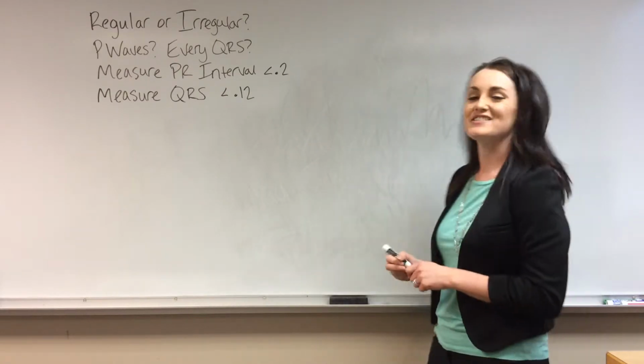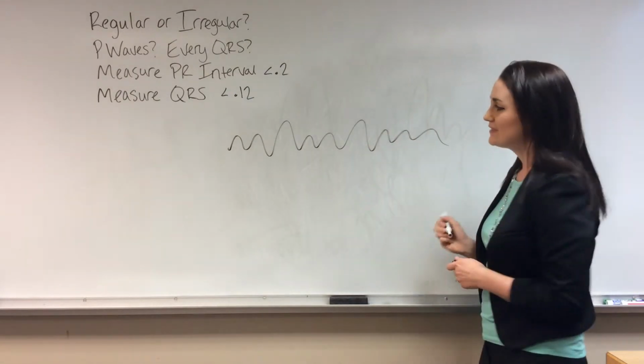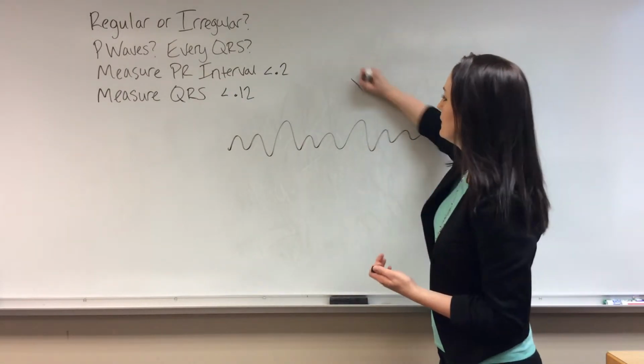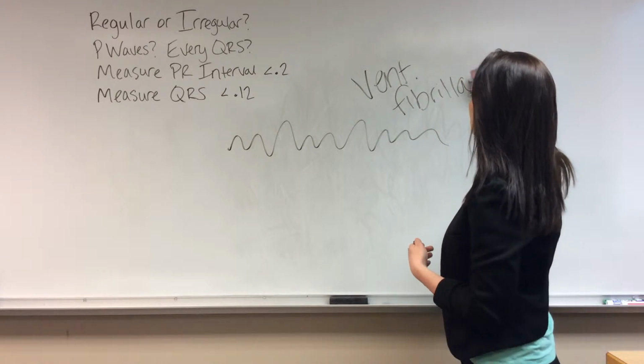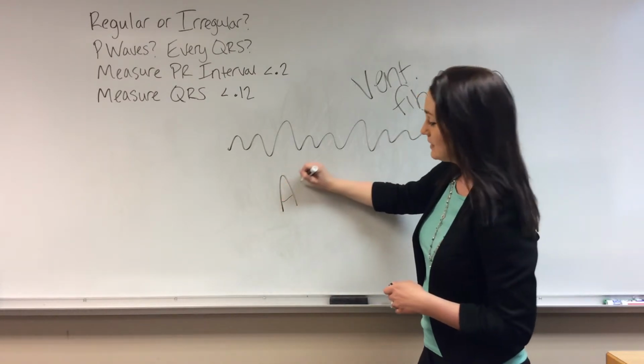Okay, on to our next one now. This one is ventricular fibrillation, or VFib. Ventricular fibrillation. This one is always pulseless.